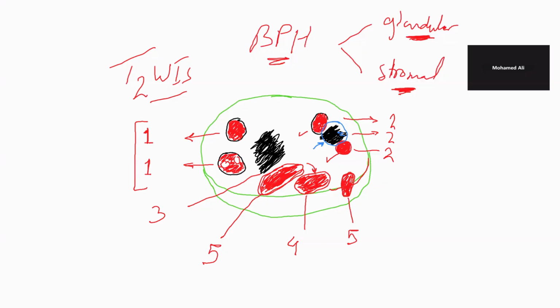My last step here, sometimes a typical nodule, something like this one, makes a bulging of the pseudocapsule. This one is a benign feature. Take care of this point. I'm talking about a typical nodule with well circumscribed margin, projecting into the peripheral zone, sometimes bulging of the prostatic capsule itself, but it is a benign feature from the start, so this one is considered a benign feature.